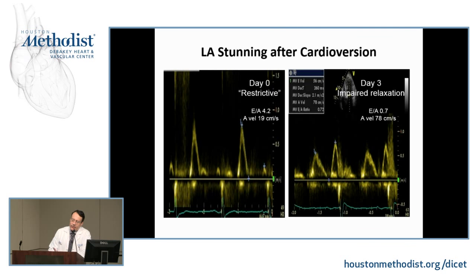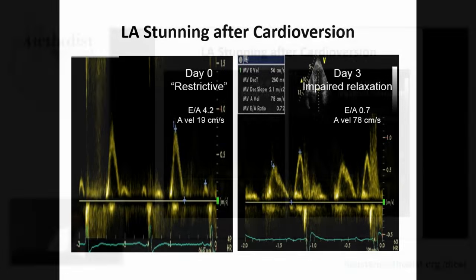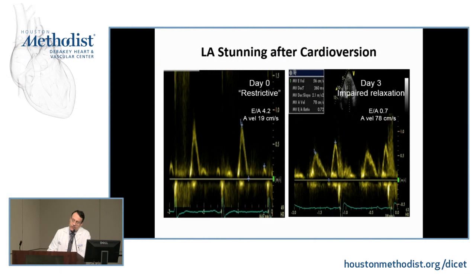Example where a clinical history can mess things up is shown on this slide. So ignore the title here and let us just look at the mitral inflow. Very high E, minuscule A, restrictive filling, okay? Well, the reason this looks the way it does is the patient has just had electric cardioversion. There is atrial stunning, atrial contractility goes down, mitral A is very small. So this is not true restrictive. This is what you can refer to as pseudo-restrictive, and one should not use it to draw inferences now.